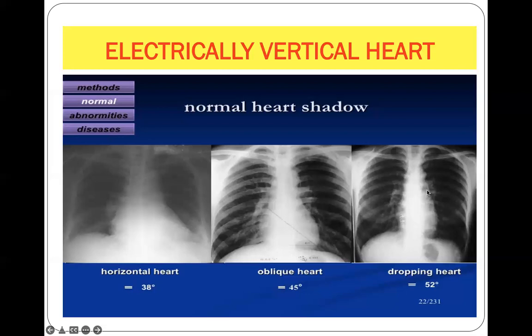So both leads look like they face each other. Looks like they are shaking hands with each other. They are good people, they are right people from the right side. So this is the right axis.